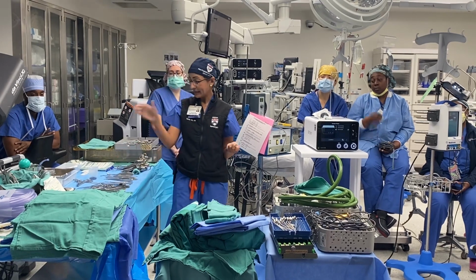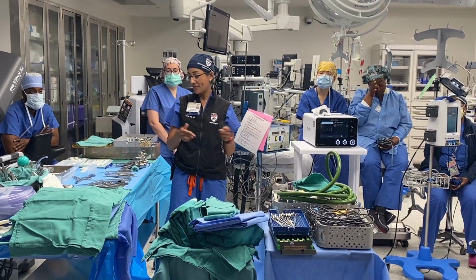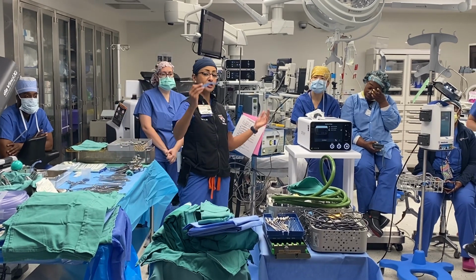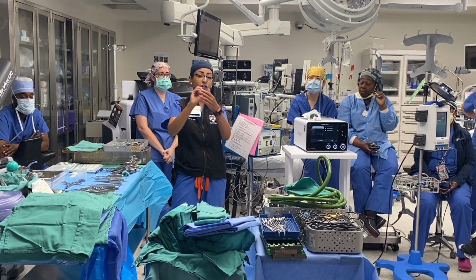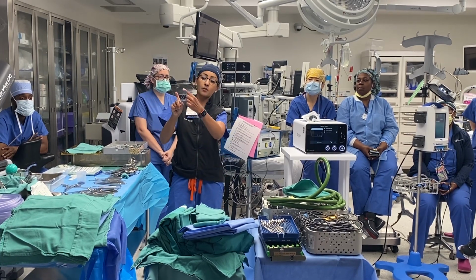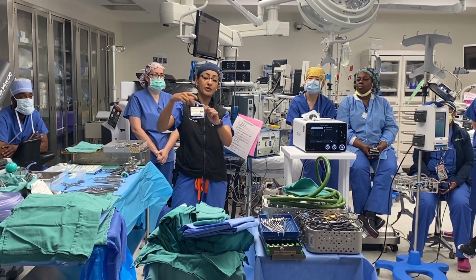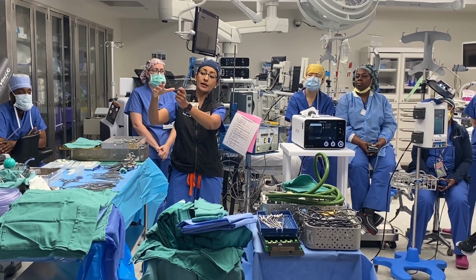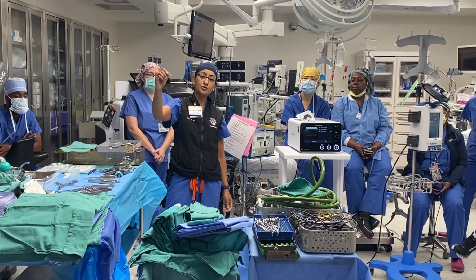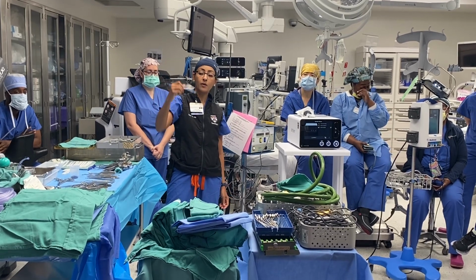And so the dura is that covering. We still have to open that, okay? And the way in which we're gonna open that is typically, neurosurgeons love bipolars. These are bipolars. Think of it as like an extension of your finger. So this little bend is always on the top when you're handing it. And usually we're just using it like a pencil. So you're just gonna hand it, and this is sort of pinch and bipole, okay?